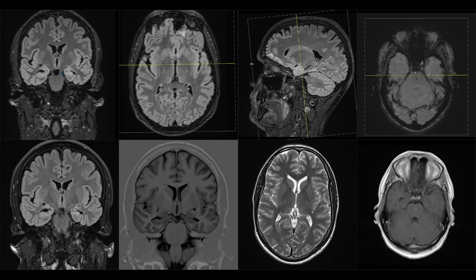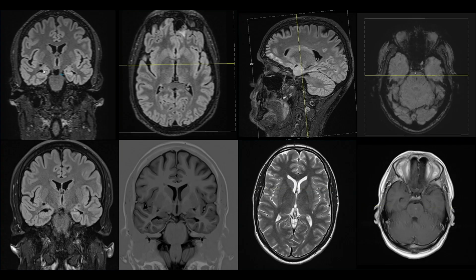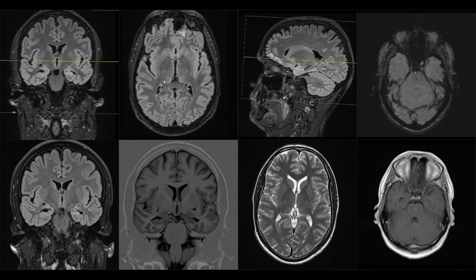Hello, this is the case of the epilepsy patient. Here are the exams 12 years ago, those two coronal sequences when the patient was about 30 years old, and now the current exam when the patient is 42 years old.